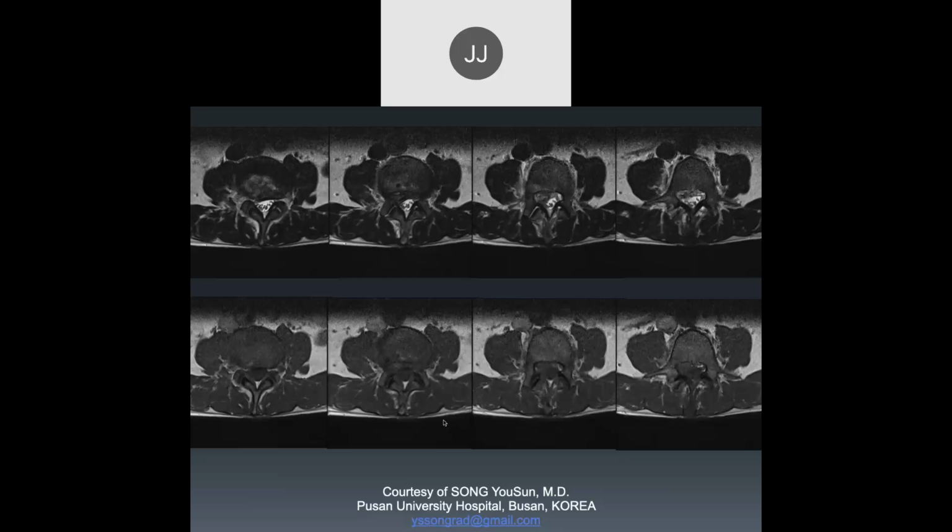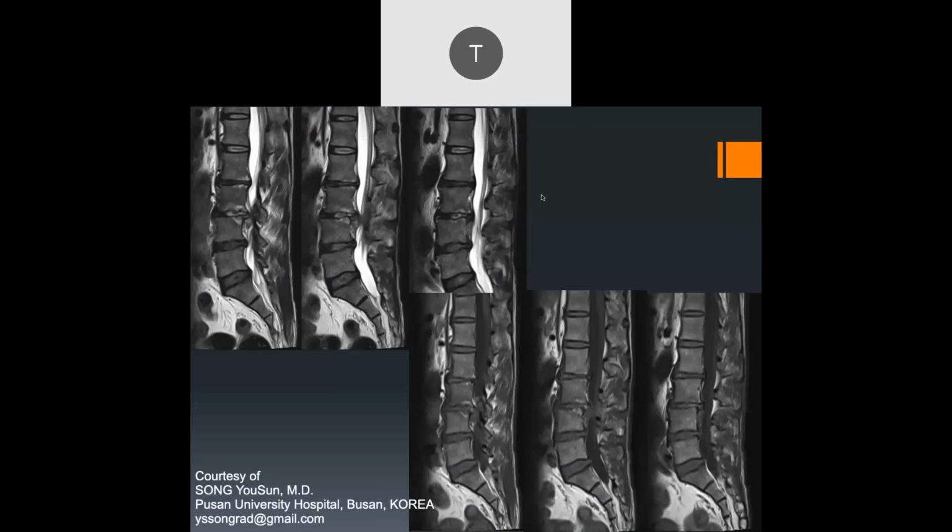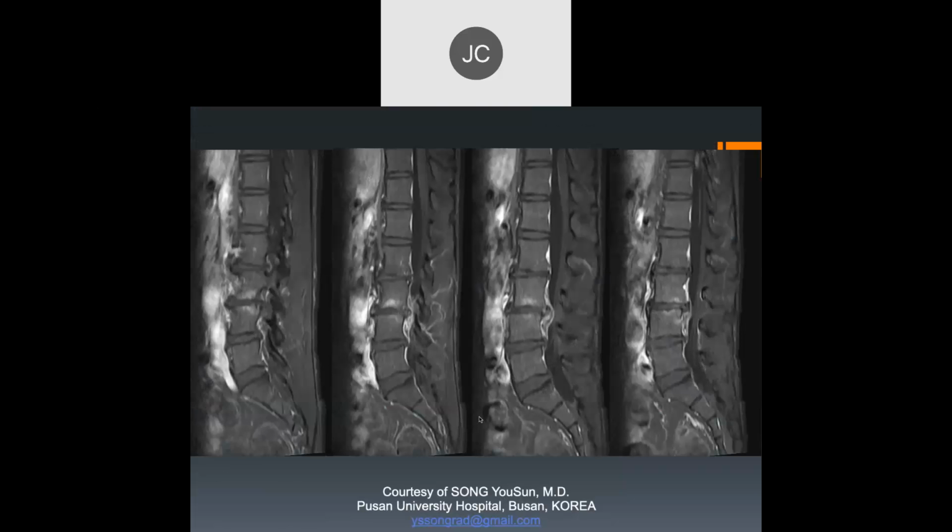Here are the axial images. All right, so T2 shows bone edema and disc edema, with mass effect on that anterior thecal sac there. Yeah. So here, if we look at these, you could almost be concerned that you've got a big disc extrusion here, right? Yeah, through here. Okay, but here are the post-contrast images.